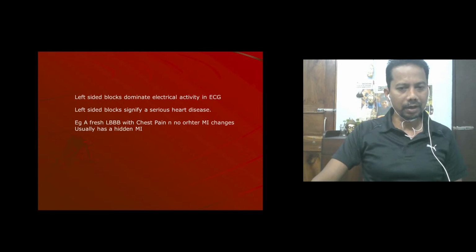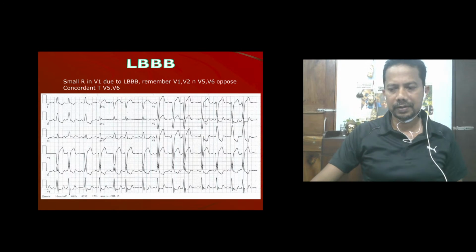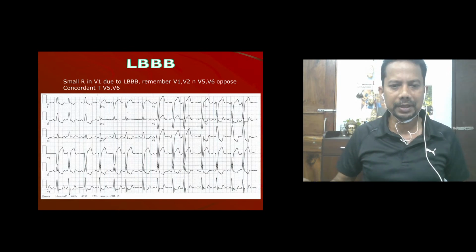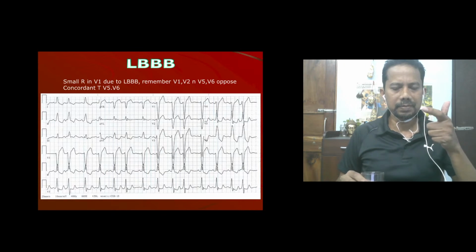Hi Gurpreet, welcome. So now we'll see some ECGs, and just look at this ECG, guys. Spend 2 minutes on this, then I will ask you. You can type in the comments what you see. You have to calculate rate, rhythm, axis. Just tell me this.